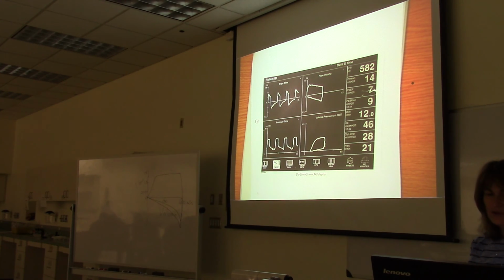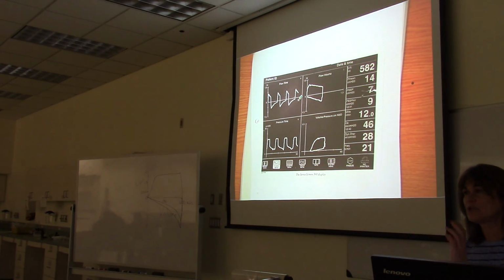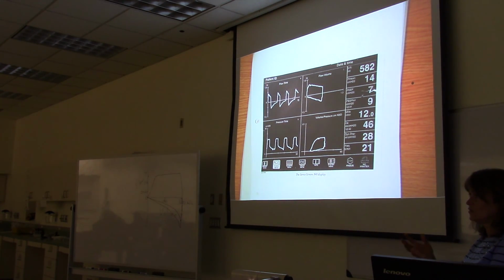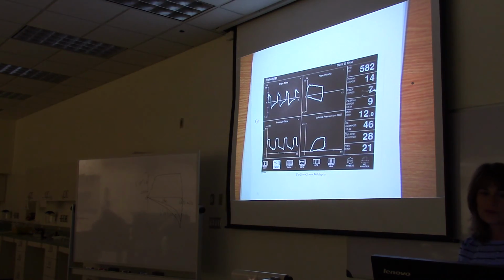And then on the ventilator, you can pull up airway graphics and look at your flow over time, pressure over time. When you're looking at a waveform over time, another word that's used is scalar, S-C-A-L-A-R. So this is a flow time scalar. Instead of hearing the word waveform, you'll hear the word scalar if it's showing you breaths over time.